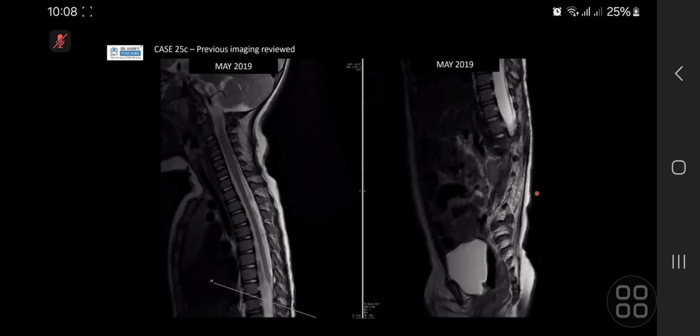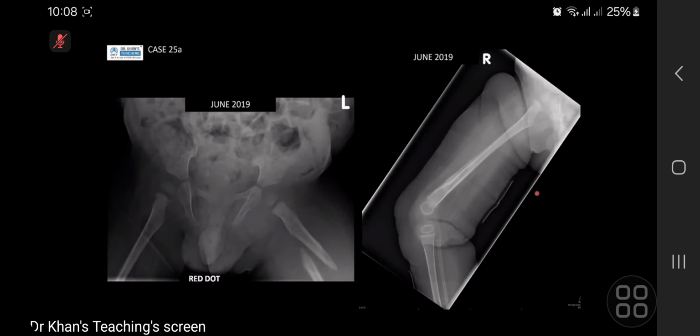So are you still going with pathological fractures? Sorry, it's a difficult case. Essentially, what I was just trying to show you was on the line of insufficiency fractures. I like the fact that you thought, so let's go back to what you said. There is no metaphyseal lesion here. Yes, there's a little bit of irregularity here. I just wonder whether it's due to its position or whether this could be some sort of heterotopic ossification from some other cause. But the metaphysis is clean, your epiphysis is clean.